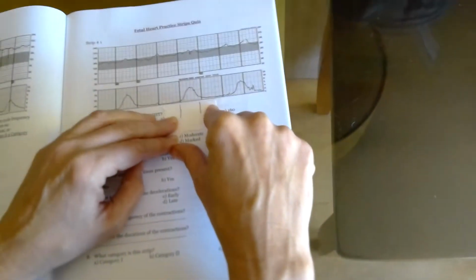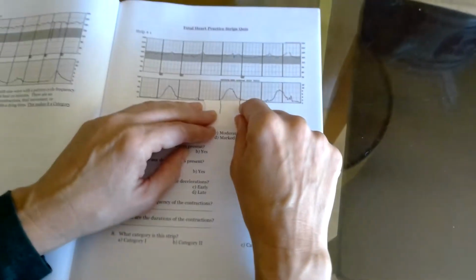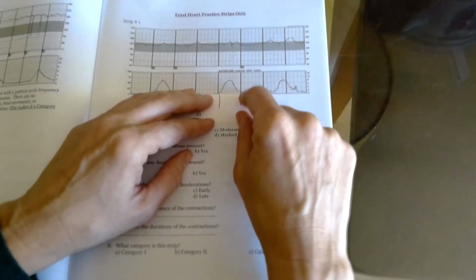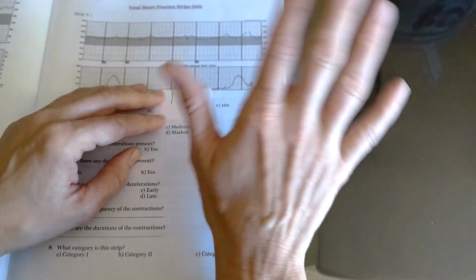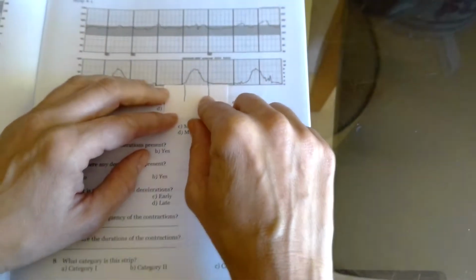We're going to move here to the second contraction. Again, I have the first line pretty much where the contraction first starts. Here, the whole contraction's over pretty much in that 60 seconds. We can call it 52, but I would say not 52, but we can also say 50 seconds. But 60 seconds would work for this contraction.